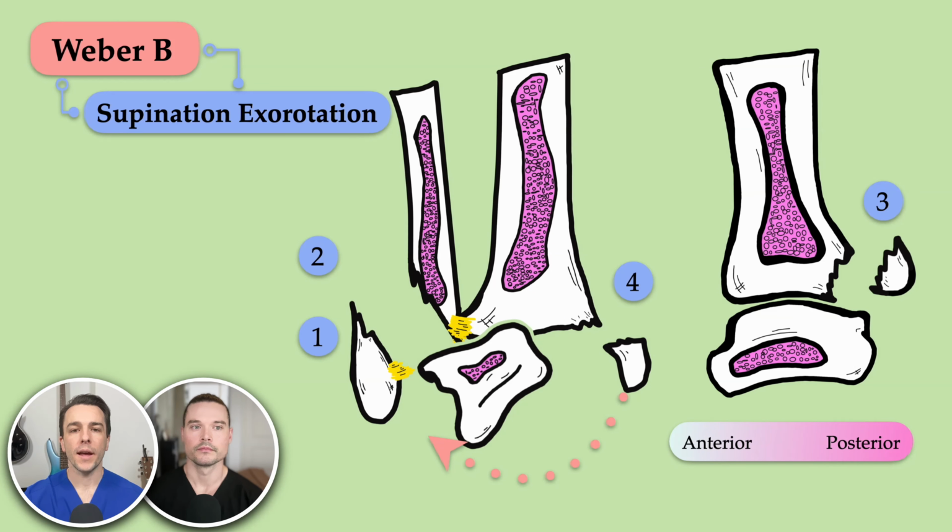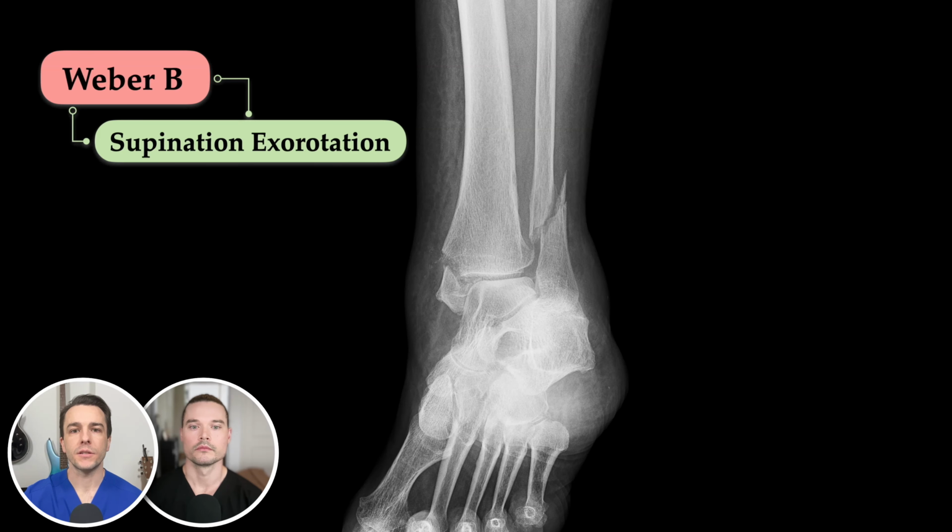So here right away, I think a monkey could call this some sort of fracture in the ankle, right? So we're looking at these fractures and we're trying to figure out how to classify this unstable ankle fracture. Let's start with our fibula right here. If you trace this fracture line all the way down, you would see it's transsyndesmotic, which means it's a Weber B. Next thing we need to figure out is the Lauge-Hansen staging.